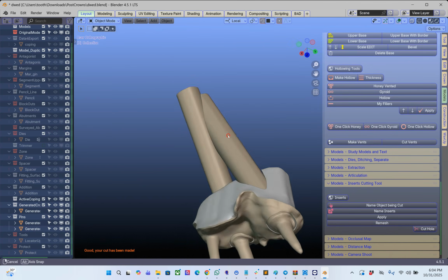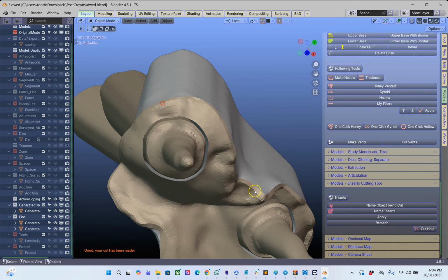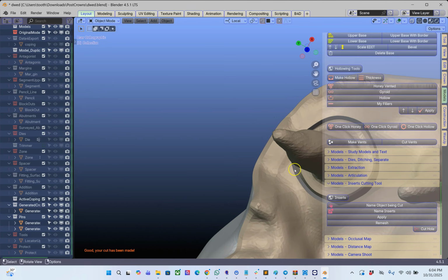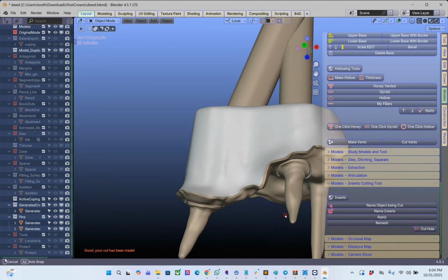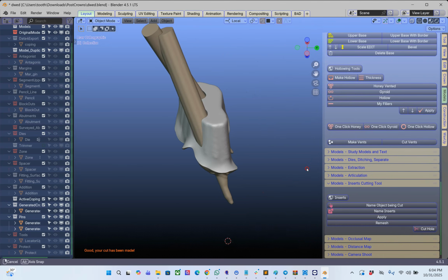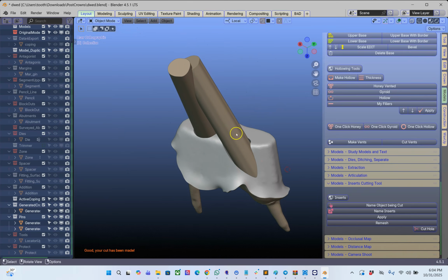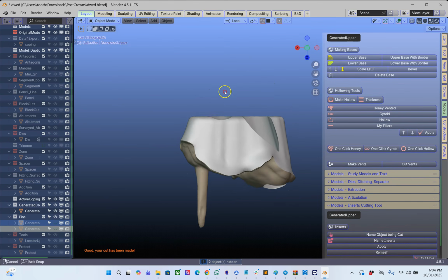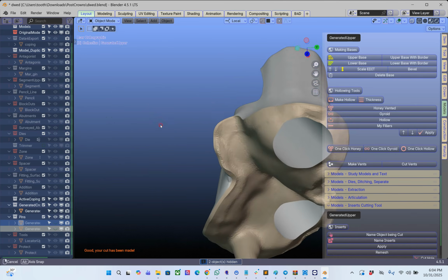So we've got an offset here and we've got our post. So maybe you can have a little bit less offset. It depends on your printer specifications. And this then concludes the video. We've got 2 pins that go all the way down, engaging.